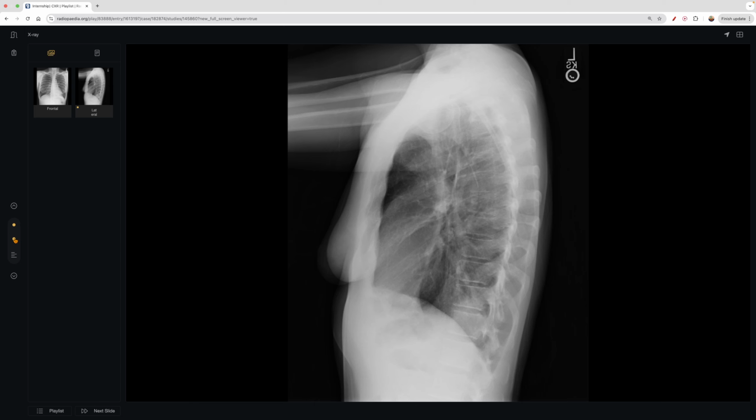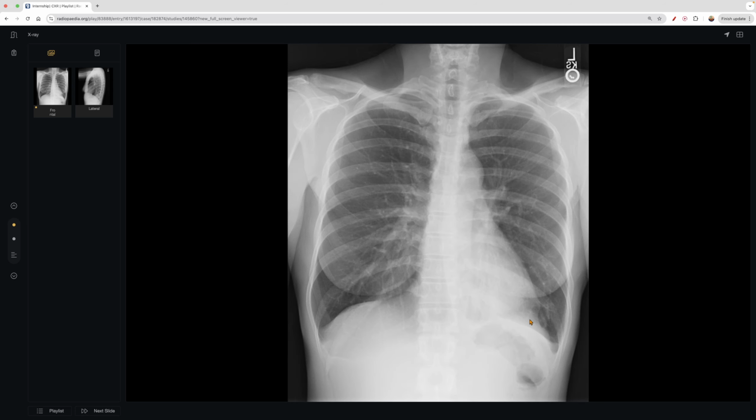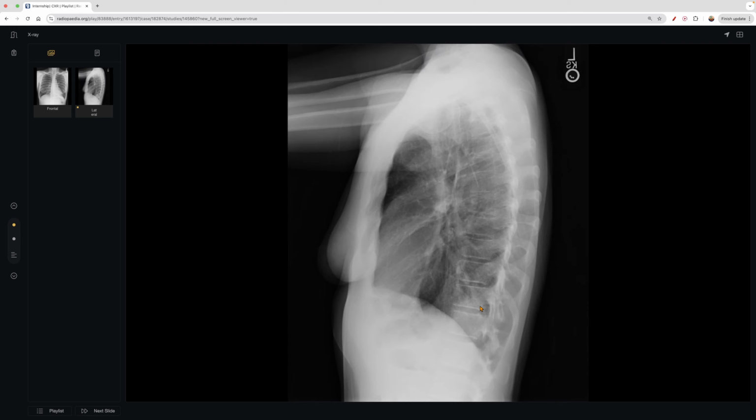And then let's see what this is. And then this was the follow-up. So you can see here that the heart doesn't look as hyperdense, right? I mean, look at that. That's much different here, right? And then we look at the spine, and the patient serves as their own control, right? It's dark, hyperdense, expected, and then it gets more black. That's, again, what we want to see versus the spine sign, which is when the patient has something here.